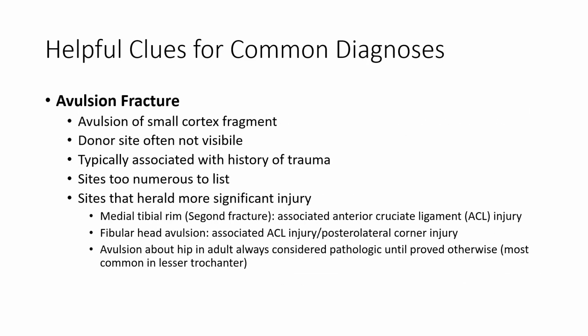Avulsion fractures: avulsion of a small cortical fragment, often not visible, is typically associated with a history of trauma. Some avulsions herald more significant injury.